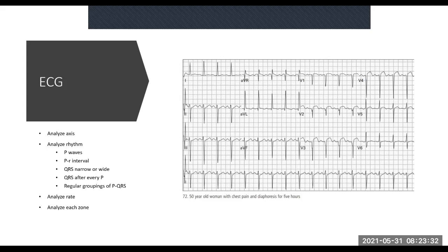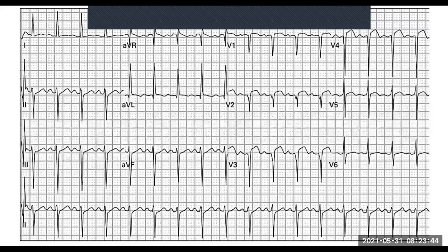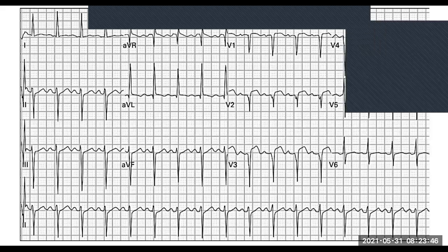And then we build up to the point where you can look at this, like how these guys are looking at it, and say, yeah, it's not so bad. In fact, that's why I say today is a relatively easy one. But for some people joining us, it might look like, what is this? All right. So let's just hide this for a little while.